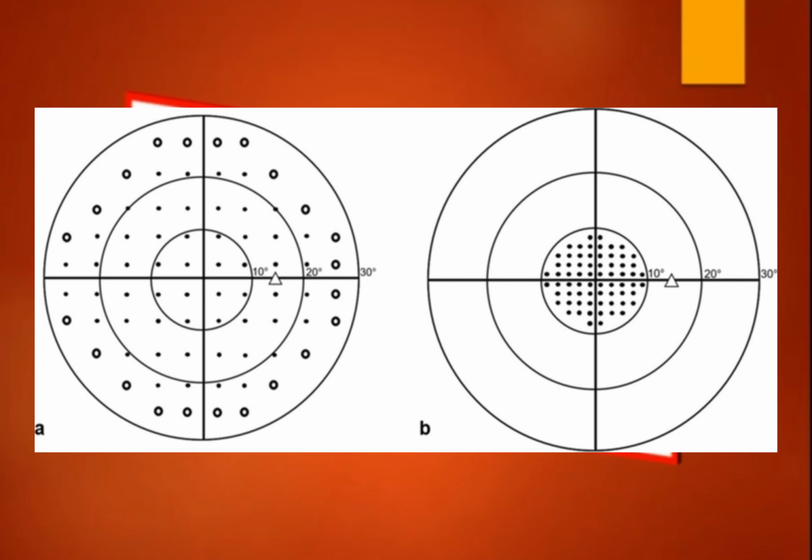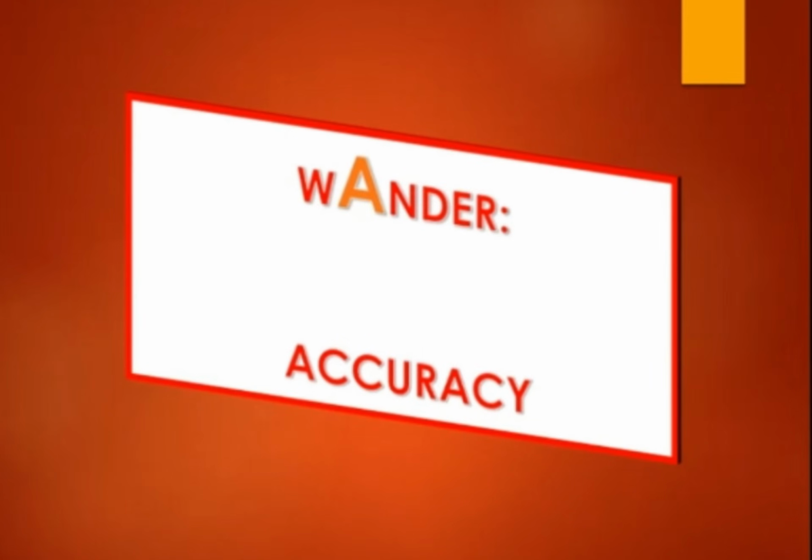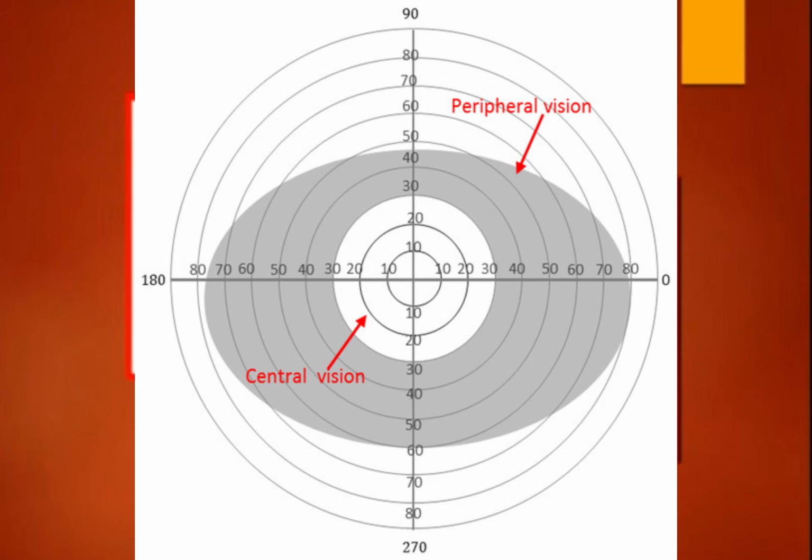Then the central 24 or the central 30, they are identical actually, just that they are only 6 degrees apart. So the central 30 or the central 24, you can think of it as a bigger circle, quite bigger than the central 10, extending about 1 to 2 feet from the center of vision. And then the central 60, which is the largest, is a very big circle extending about 3 to 4 feet from the center of vision.